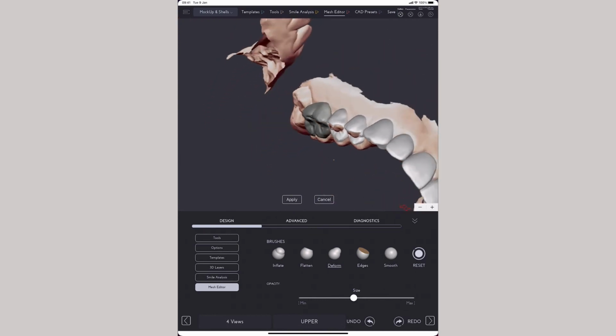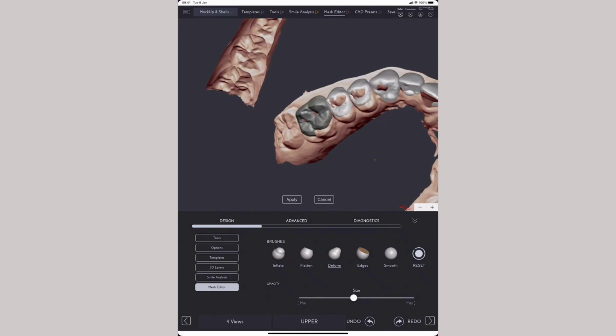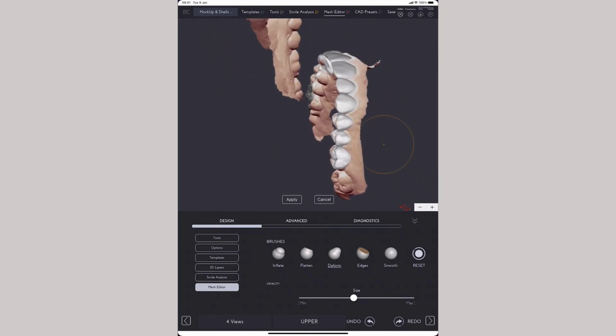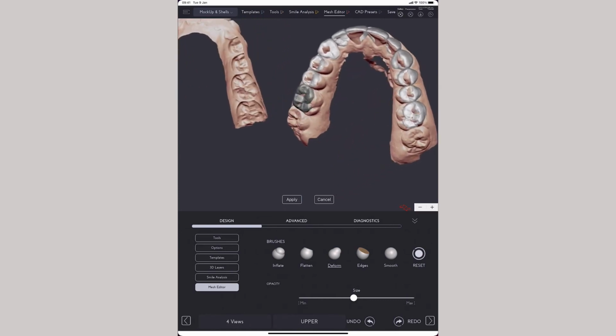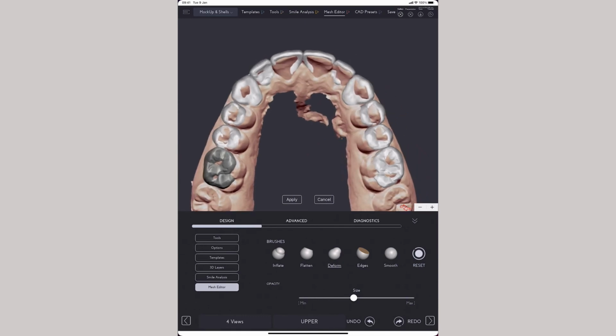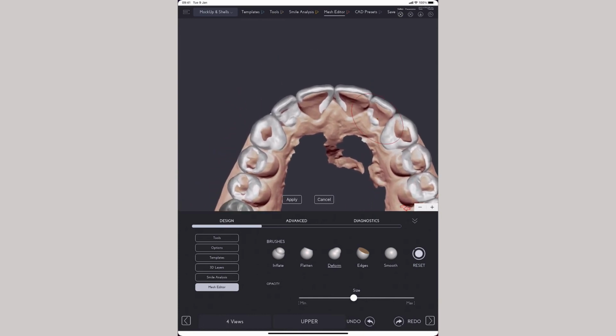And so that's one way to adjust the tooth template. I don't recommend you do it for every single tooth. Just make sure you have the right width. But of course, if you need to adjust just one tooth, especially on the molars or even the premolars, that's fine. I don't recommend it for the anteriors because that will change the width on one side. Okay, so you want to keep the symmetry as much as possible and do fewer adjustments.